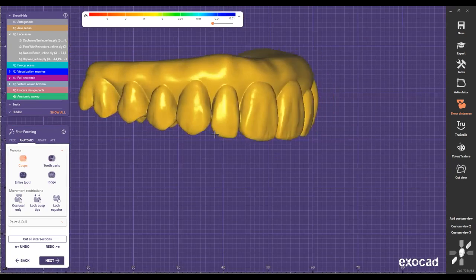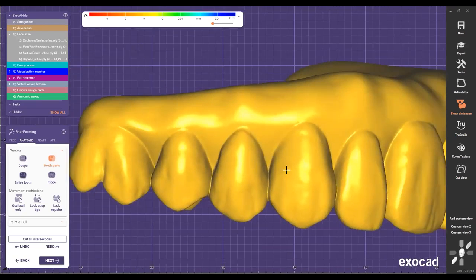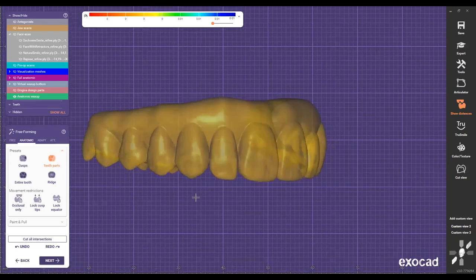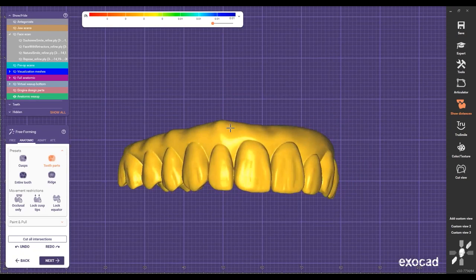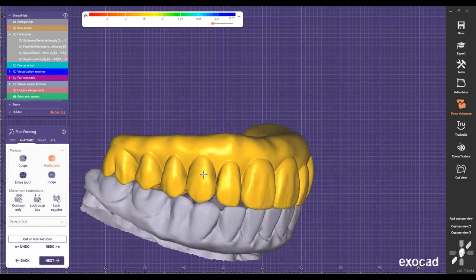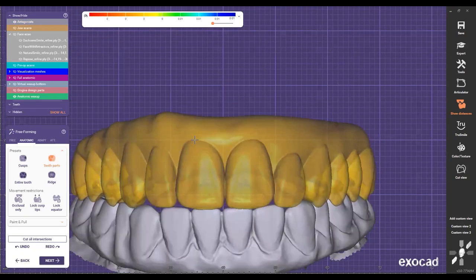So same thing here. When I go on this one, I'm gonna make sure that this cusp right here, everything looks right when I go with the card. So I'm gonna put the card and then line them up with the distal, so the way I can just pull this here, but I'm pulling from a surface where I don't modify the contacts or anything, okay? In this case, I'm gonna double check the contact points, but let's say I'm done, I'm happy with this one. Everything looks good right there, like the central, lateral, and then everything else just follows.